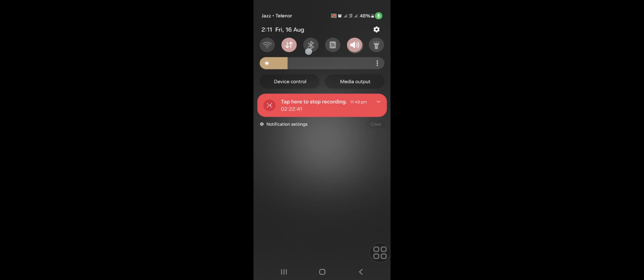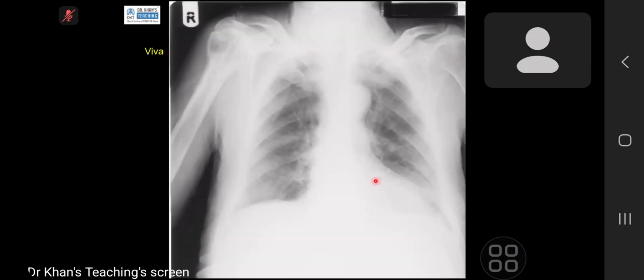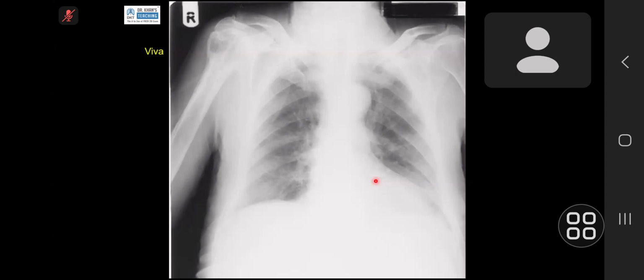Yes, in comparison with the other left humerus, I can see that there is cortical thickening involving the proximal part of the right humerus, and also increased trabeculation of the proximal right humerus, and cortical periosteal reaction is noted. I want to see if this patient is a known case of Paget disease. With this finding, it could be representing a malignant transformation of the Paget disease.